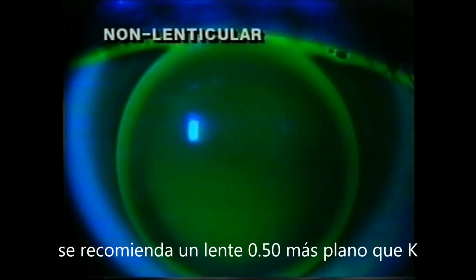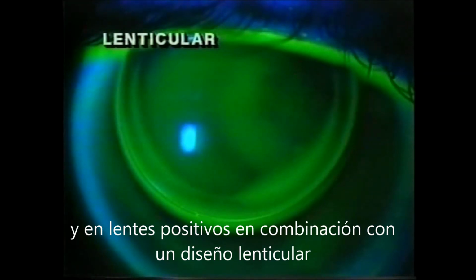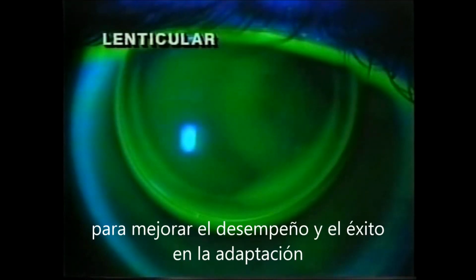When fitting a low astigmatic hyperopic patient, the use of a steeper than K base curve radius in combination with a minus lenticular edge design will increase the probability of a successful fit.